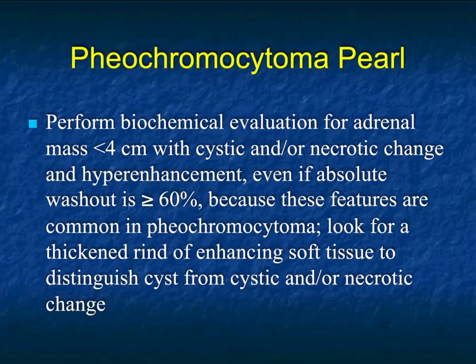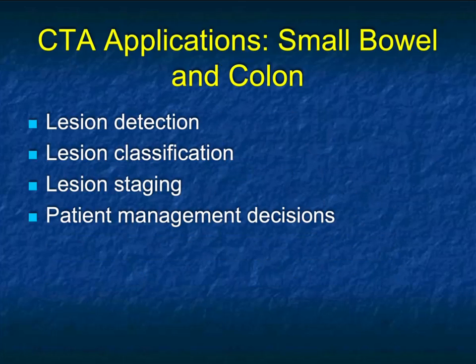Again, with pheos, 70% of the pheos we picked up are incidental findings. Pheos can be very vascular, which also explains the patient's lung findings. One of the things with pheos is you can have an enhancing rim, and we've seen some cases of that as well.